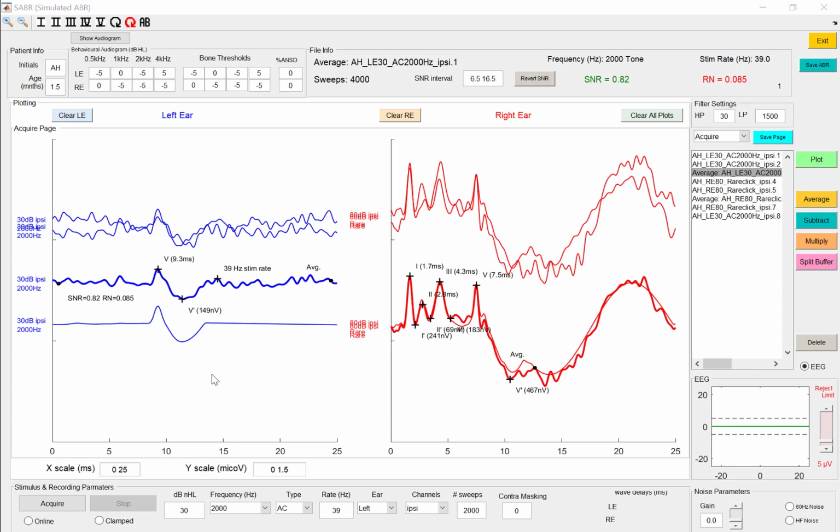So this concludes the first tutorial on the sABR program, and I hope you enjoy going and playing, turning off and on the noise and recording ABRs under different noisy conditions, as well as across the different types of stimuli that we can provide in this program. So thank you for taking the time to go through this tutorial, and most of all, enjoy playing around and simulating ABRs and have fun.